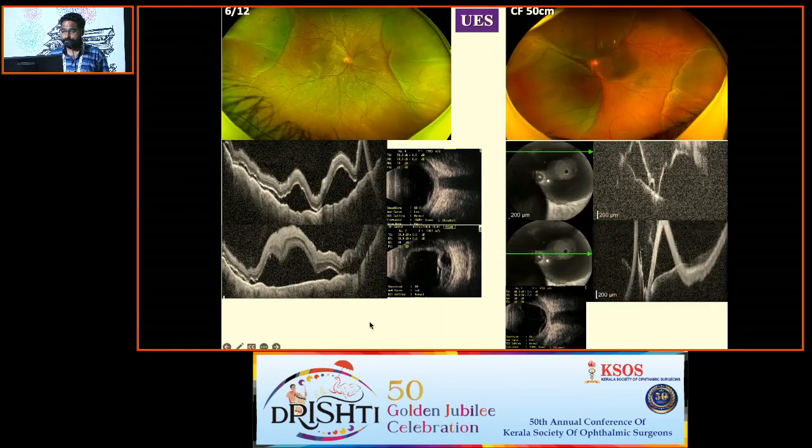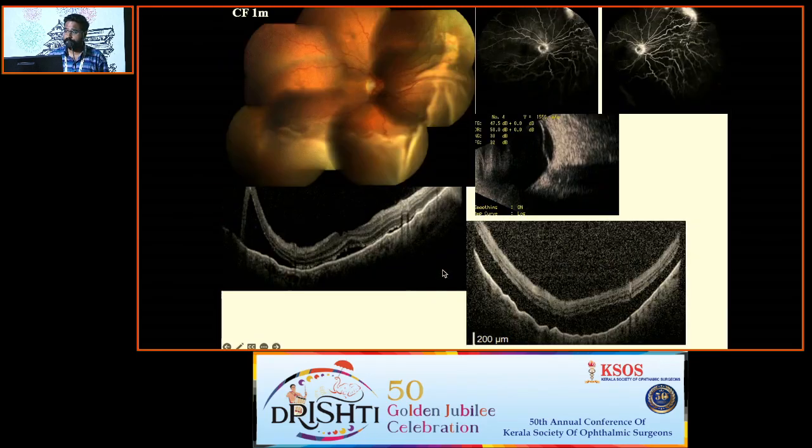There is a patient with uveal effusion syndrome in which peripheral examination is very important because this is a diagnosis of exclusion, and the treatment also varies. OCT shows multiple large areas of subretinal fluid accumulation as well as RPE irregularities or elevations. B scan is diagnostic as well, which shows choroidal effusions and choroidal detachments.